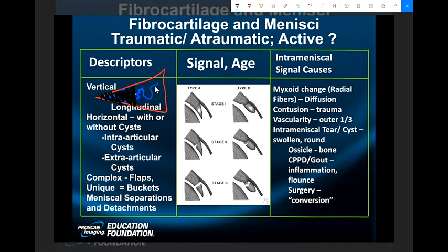Don't be chasing these. Don't be calling these out as tears to be reckoned with, because they hardly ever are. Most common cause of a patient with a meniscectomy who comes in with knee pain: arthritis. How soon? 3 months. That's how soon it takes to get arthritis after a meniscectomy. And I can prove it to you if you force me to do it. I can show you cases where 3 months later, in a 20-year-old boy, he's got arthritis after a meniscectomy.